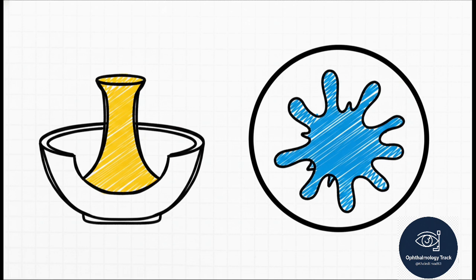Now let's move to pooling and see how this builds on our understanding of fluid dynamics inside the eye. Pooling also increases in intensity, exactly like leakage, but with one crucial difference. It fills a distinct anatomical pocket or cavity, and then it strictly stops growing in size. The dye literally gets trapped.